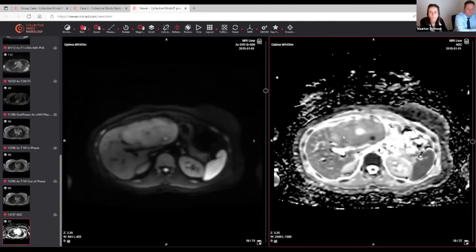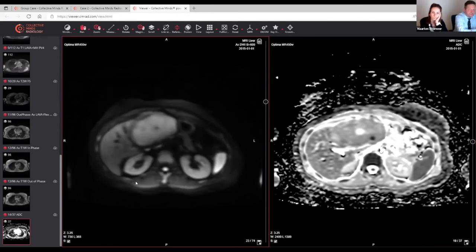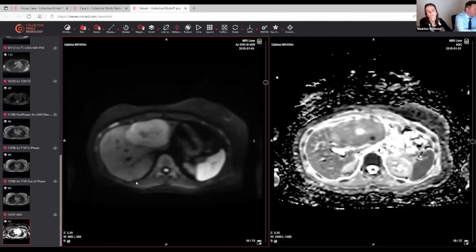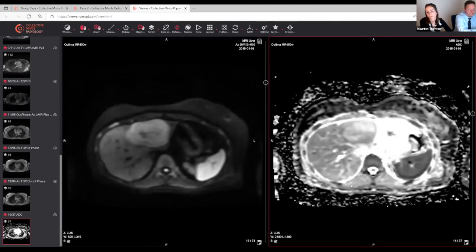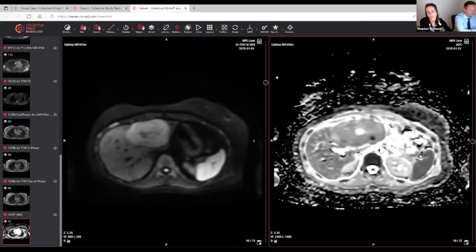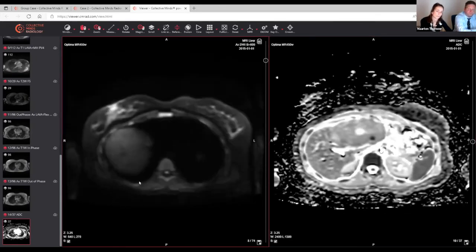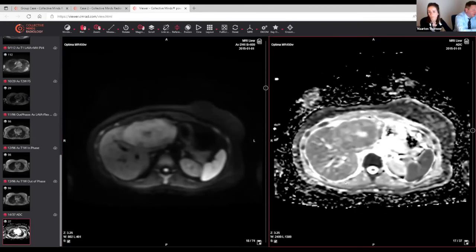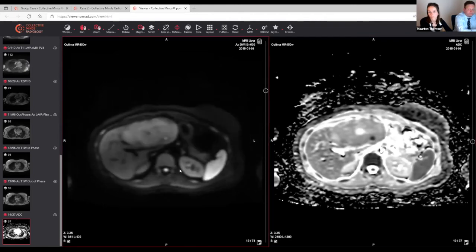You can see here, there's a black region, and that was probably the part where there was malignant degeneration. So yes, I'm not sure it can help all the time, but in this case, I think it was suggestive that there was a nodule in nodule. The lesion in segment 6 doesn't show restriction. No, adenoma doesn't show any restriction, also not the steatotic adenoma. Is it clear?